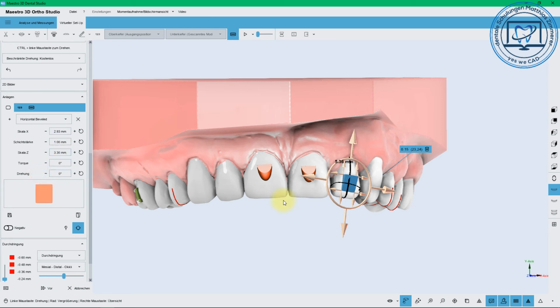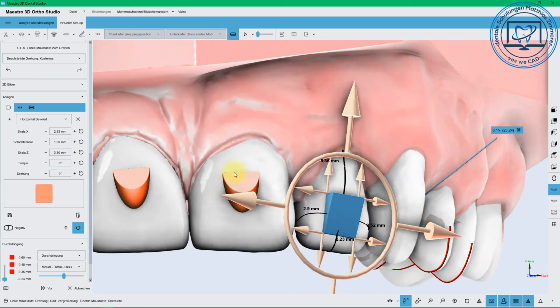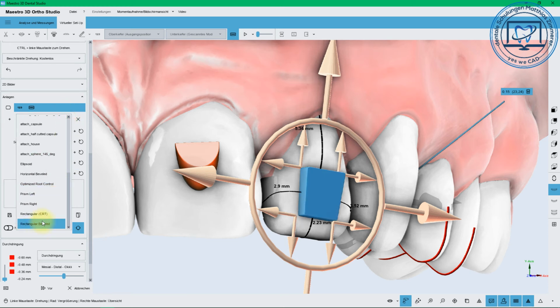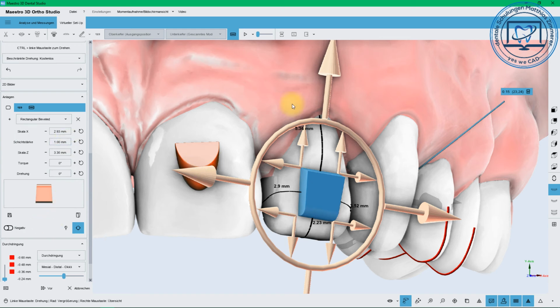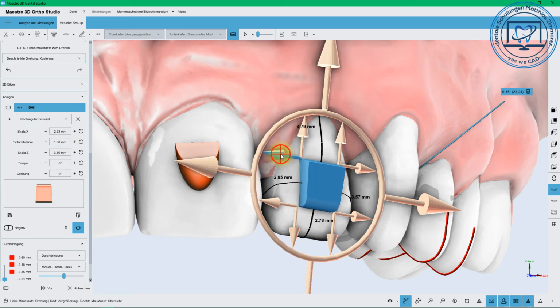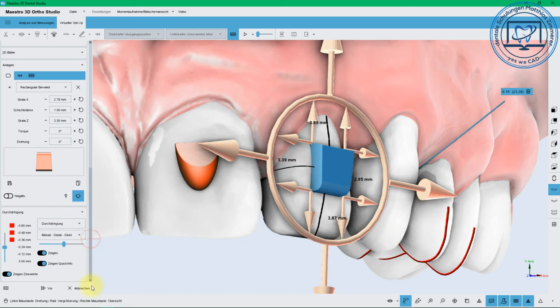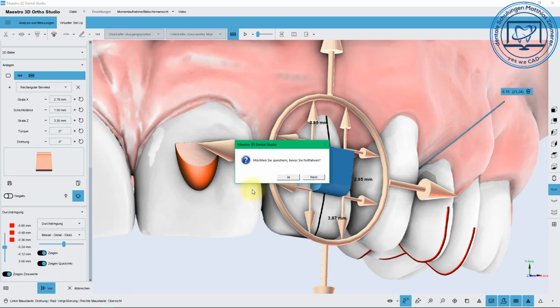This is also often a question, what attachment would you use for? Nobody can give me an answer on this. If there is a course for it, I would make it immediately, because this is the biggest question of all. The thing would be, use these attachments you have made, a good result with it. Yes, and always belongs how much is the rotation, how you need.